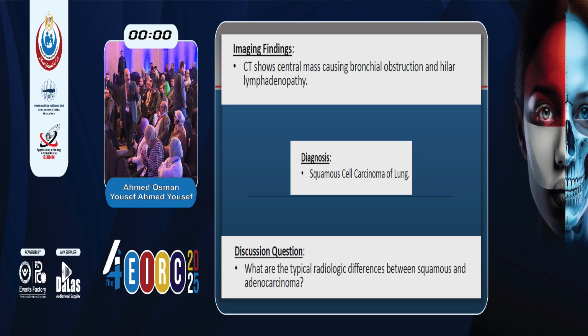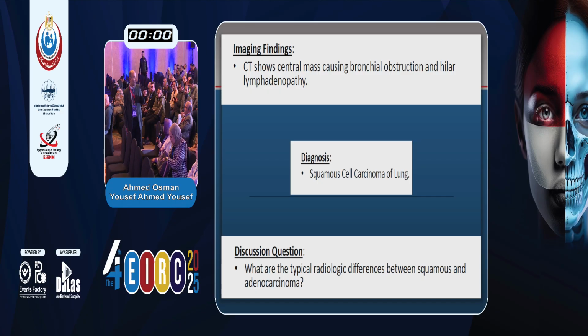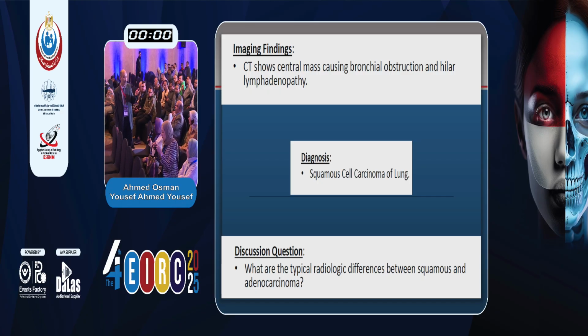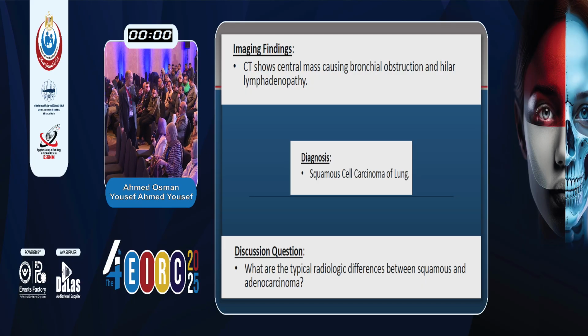Again, as we said first, regarding lymph nodes, calcified lymph node suggests TB or carcinoma. TB, yes. Is it possible to see calcified lymph node with carcinoma? Treated lymphoma, is it possible? Where, eccentric? The mass of the bronchogenic carcinoma. Is it possible to see calcification within the mass? Could be. Could be. The oncologist with us, Dr. Khaled.